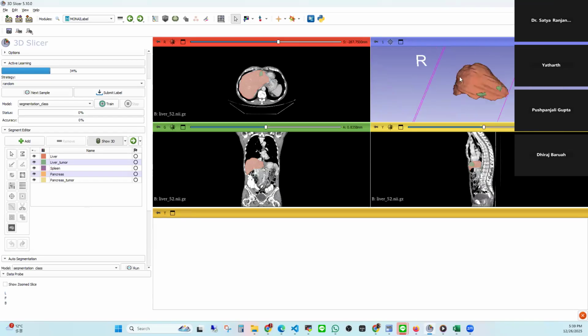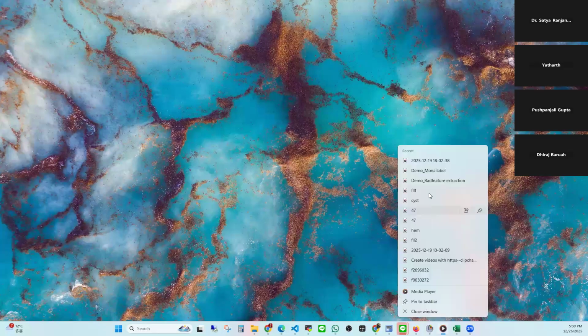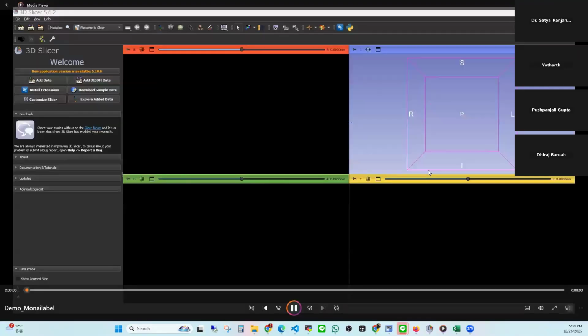For this, I want to show you one video, because when I do it now, it will take time. One takes maybe around 10 to 15 minutes. So I'll first show you a demo of how exactly it is done. This is the first video. Please have a look, and we will keep pausing in between to show it one by one.